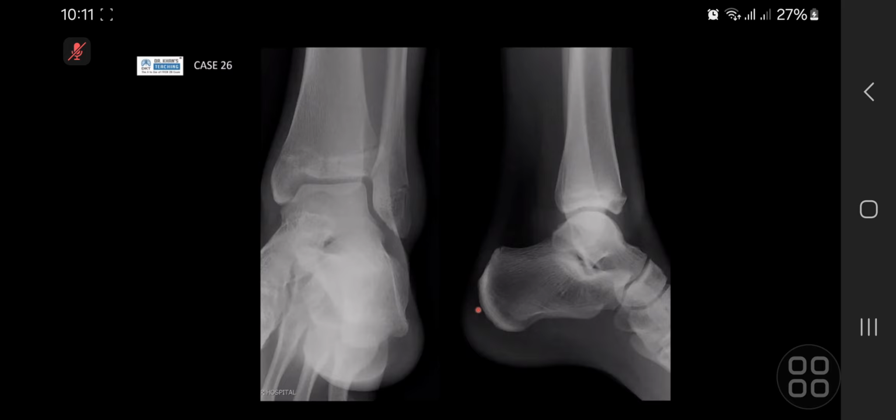So, frontal and lateral radiograph of the ankle joint. The fibula and tibia are seen. They are both normal. The talus is fine. The rest of the tarsal bones and the phalanges are fine. Looking at the calcaneum, on the superior aspect, okay, no, that's an unfused apophysis. I cannot see any fracture or dislocation on this view.